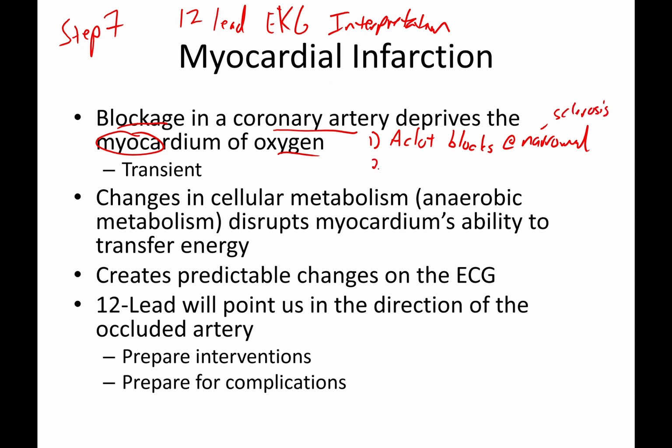Or your second one could be more of your transient scenario here, which would be a vasospasm at a narrowing.